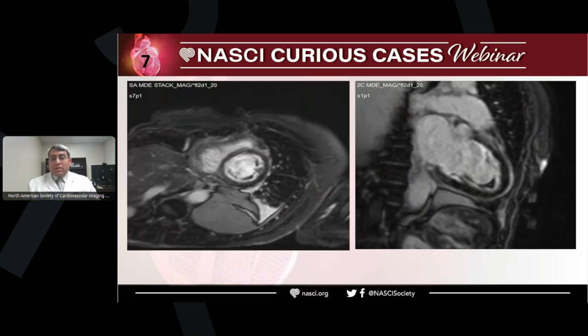It appears on the left to be, is it a thrombus? Sorry, I cannot see. What is the sequence? It is a MAG. Okay, yes, thrombus in the left ventricle, layering, maybe. And again, a dilated left ventricle. So we see here a left ventricular intraluminal signal void lesion, in this delayed contrast enhancement or LGE sequence, and it's inside the lumen, and it is probably thrombus formation.